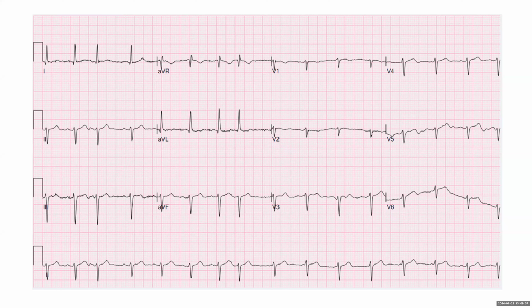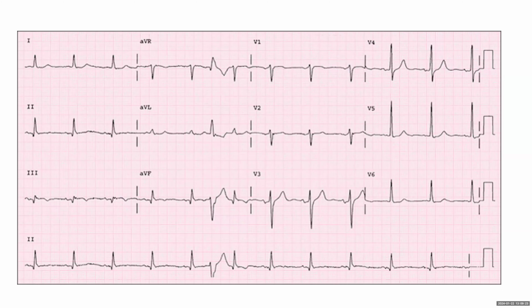Yeah. Someone wrote sinus arrhythmia. That's a good thought. But in sinus arrhythmia, you must have sinus P wave morphology and constant morphology all the time. Good. What about this one? Just the major finding.